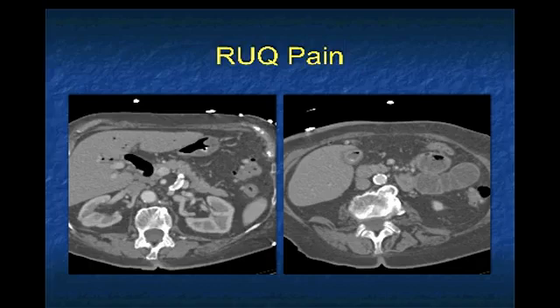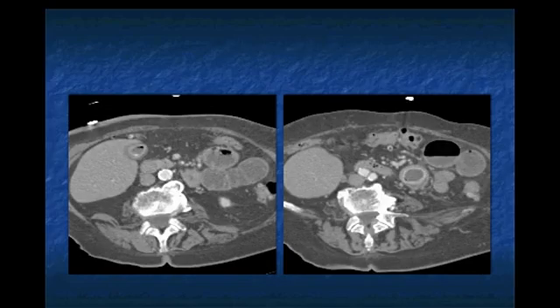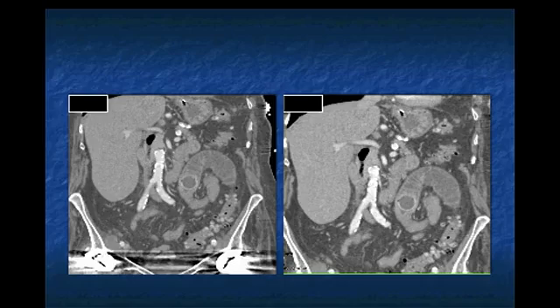Another patient, right upper quadrant pain. There's air in the common duct. There's also air in the gallbladder and dilated bowel. Now, if the patient had a recent procedure, you could say, okay, maybe that's why, but there's no recent procedure. And then you look down with the dilated bowel, there's a circumferential structure here, which is easier to see on the next study. It's a stone. Air in the biliary tree, air in the gallbladder, contracted gallbladder, and a stone in bowel.